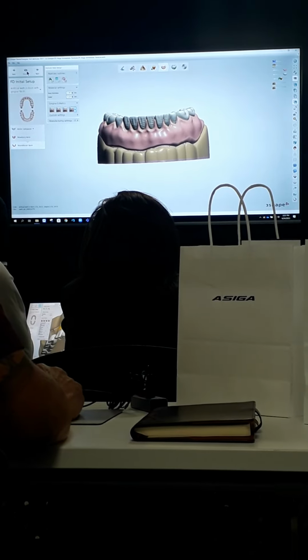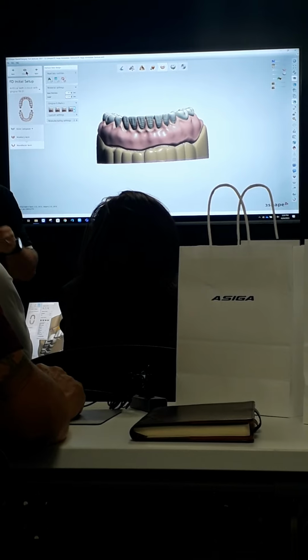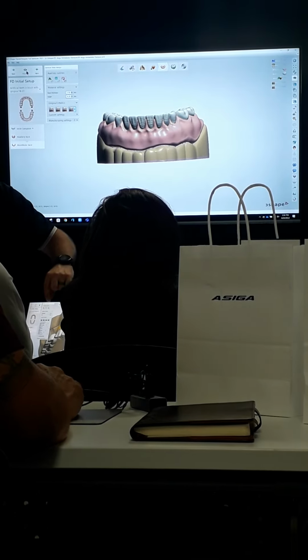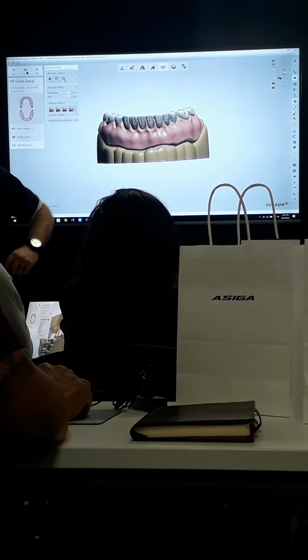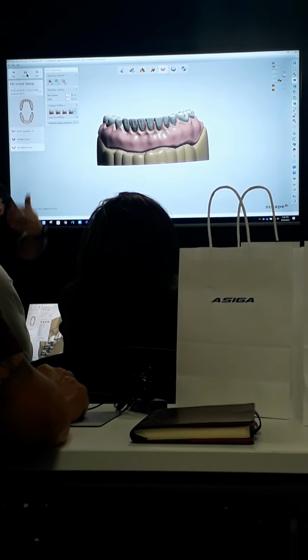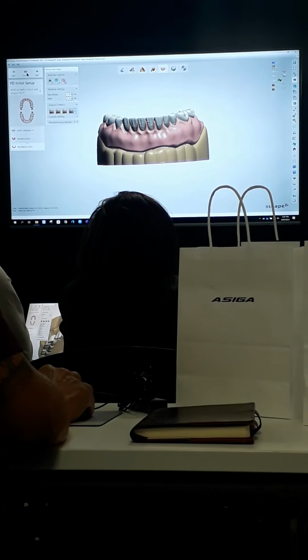So if that was the case, what the error was probably showing you is that it was outside. That particular spline is this relief zone. What that does is it adds extra spacer inside wherever you mark that. And since you put it outside the spline, that was probably why you were getting the error.